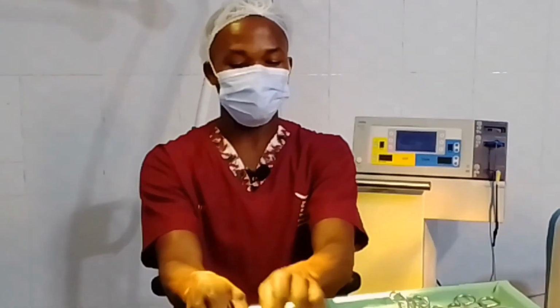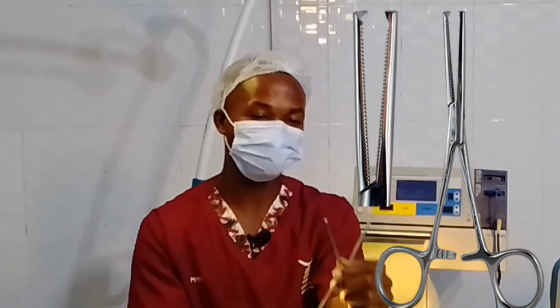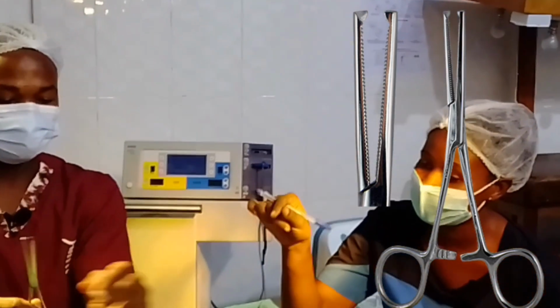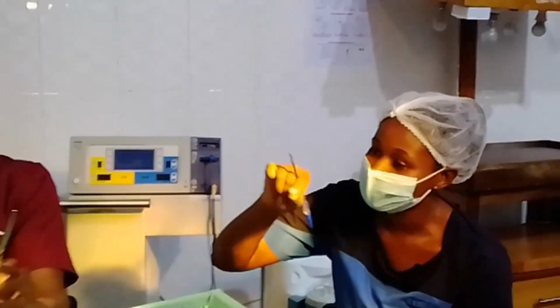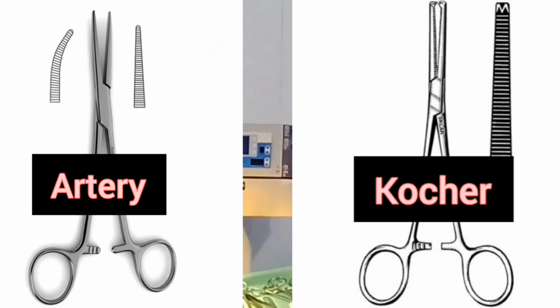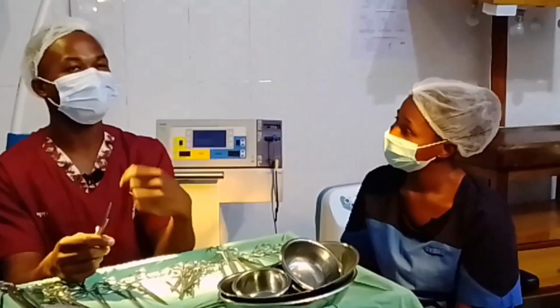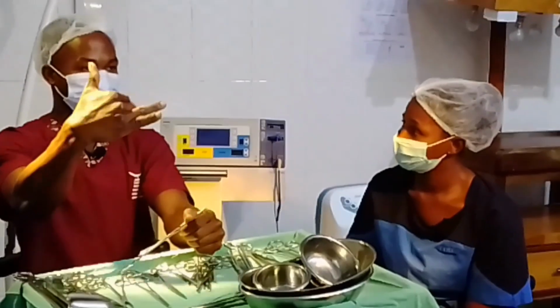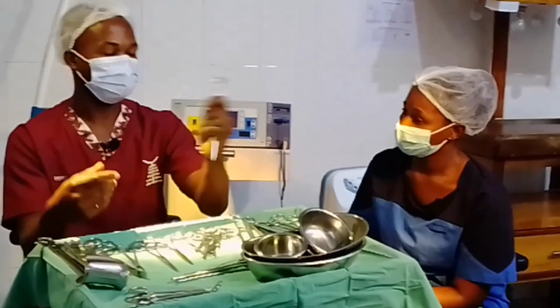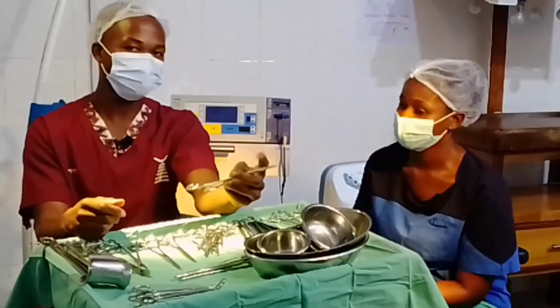Then we have here Kocher. You see this one too, it looks like the artery forceps, but there is a tooth here. So that's the only difference between the Kocher and the artery forceps. That one has a tooth at the tip. They are used to hold tough tissue, especially when you have to suture, let's say, the fascia. You see the skin will just fall on the fascia, so you just use this one, you hold the skin like this, so that you open up. It will give space. So they are used to hold tough tissue.